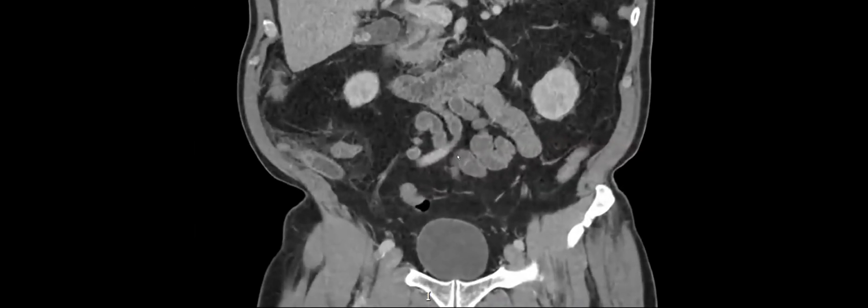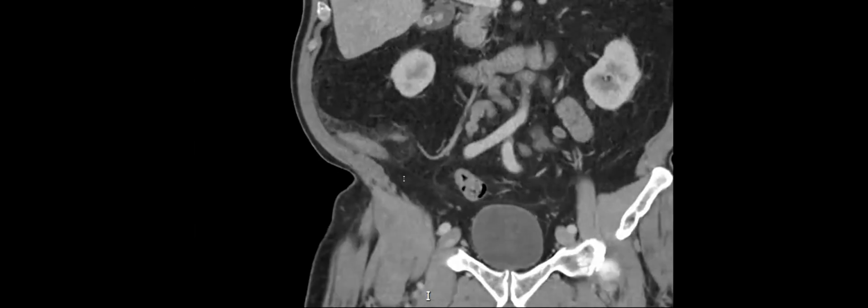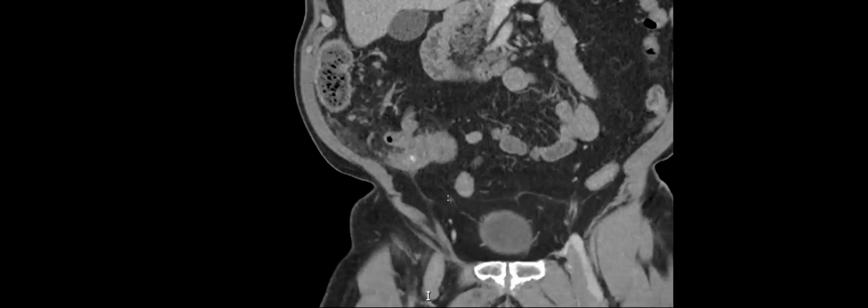What caught my eye was that appendicitis begins with obliteration of the base, be it an appendicolith or lymphoid hyperplasia in children. So the appendix should dilate. The appendix is dilated here, but at least the distal third, including the tip, is not dilated. The pressure should actually transmit all the way to the tip. So that was my question, but I just said appendicitis and I moved on.